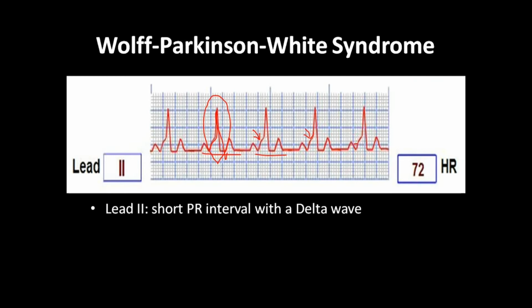Okay, it actually looks like the QRS complex starts from here and the isoelectric line is going upwards. Actually it should be P wave, then QRS complex and T wave. But here the delta wave is overlapping. So P wave, then it goes QRS complex and a T wave. Okay, this delta wave is seen in this case.